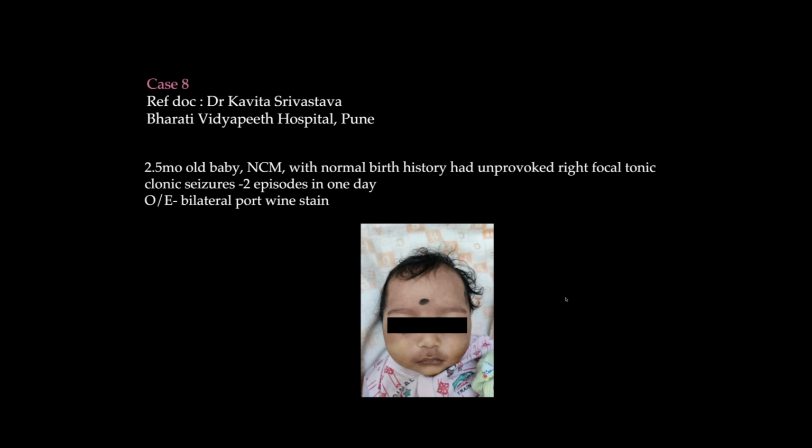And the reason I was provoking this question was because yesterday we had a similar discussion with Dr. Sarah Ellett, who does most of the SWS work here in the UK. She asked me what is the right time frame, because can we pick up the pial angiomas early? And the answer is yes, but they do need an MRI and they need contrast, and they probably need a FLAIR contrast for that as well. But I think you have the answer on CT here as you were showing, so I'll let you proceed.